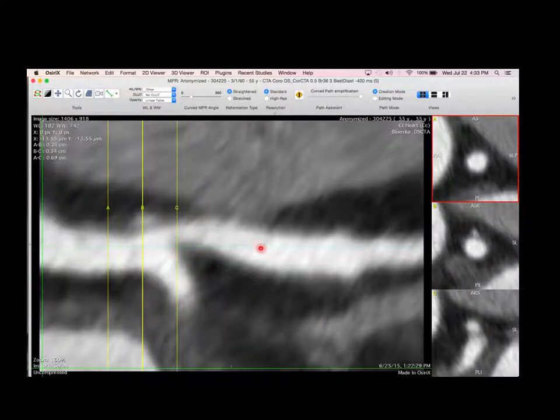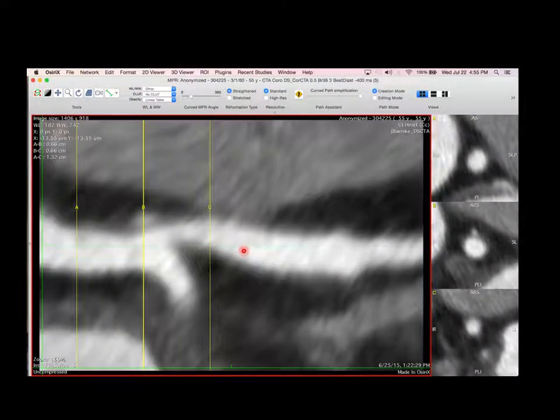And then when it gets to the left anterior descending, which was our last slide, it's actually quite big again. So that's probably not good, right? When you see things narrow down and then get bigger, it's not a good design. You actually want the thing to monotonically narrow as you get further distally away from the source. You don't really want it to go narrow, then big, then narrow, then big. That just causes problems, right? Like flow deficits.